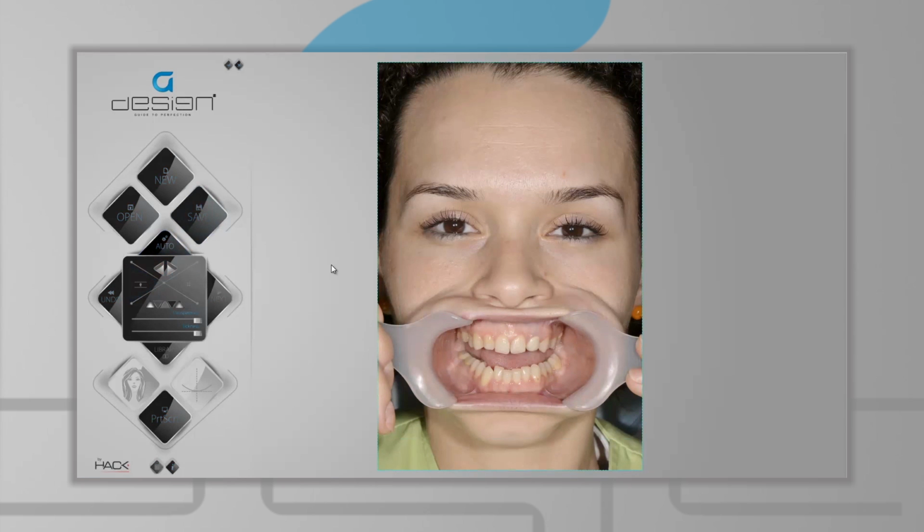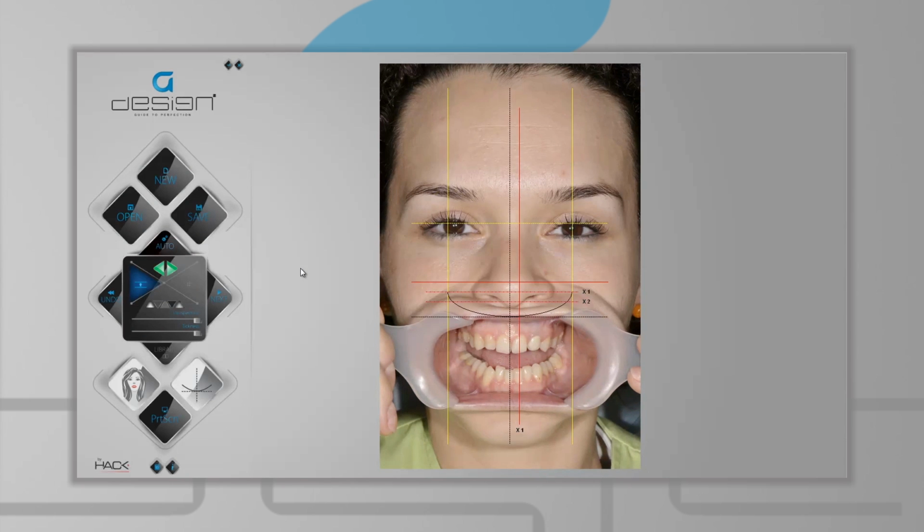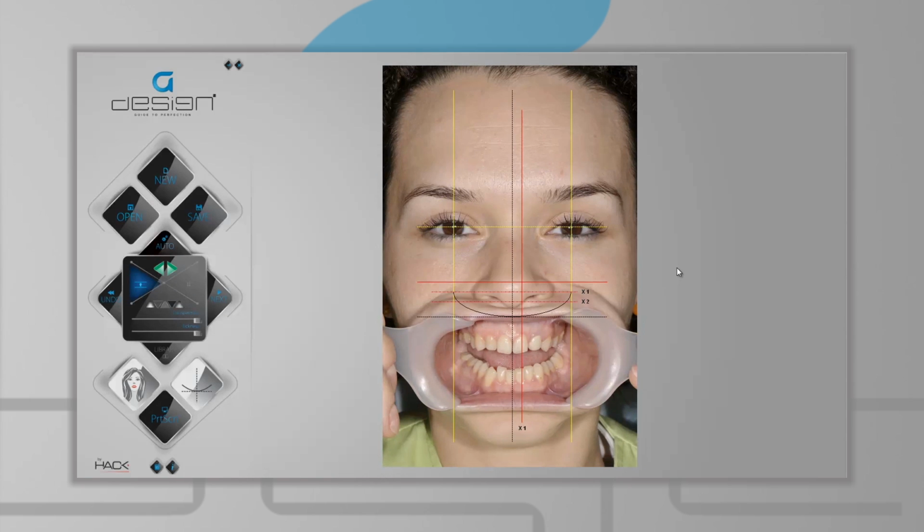Once the pupil marks are set, be it automatically or manually, the two buttons on the left corresponding to them will light up green. Resetting those marks is also possible by simply pressing the respective buttons, which will then light up red. After the pupil marks are set, the application will automatically rotate the image so that the line between the two marks is perfectly horizontal and will then highlight the facial axes, the incisal edge, and the guiding lines.